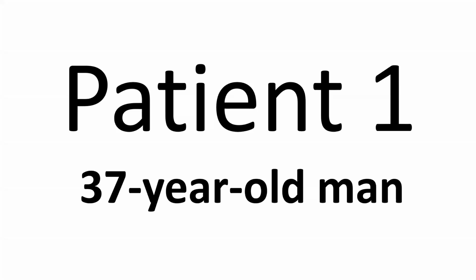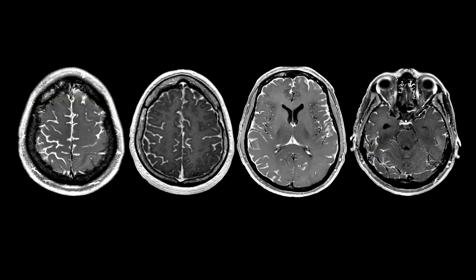You know what? I think we are ready to move on to patient number 1, a 37-year-old man. All right, everybody feel warmed up? Are we warmed up enough? Yeah. Okay, we spent 36 minutes warming up. Let's try a real patient. Okay, I'm looking for a differential diagnosis. These are serial axial images, serial cuts, T1 with contrast. Diagnosis.